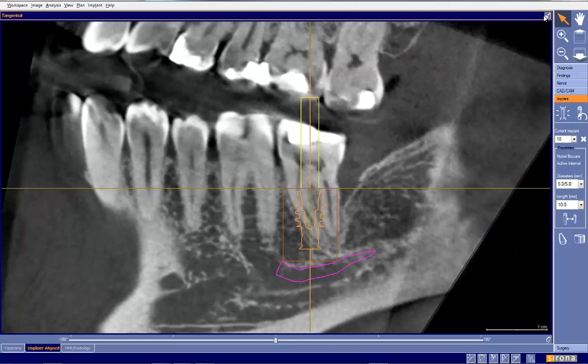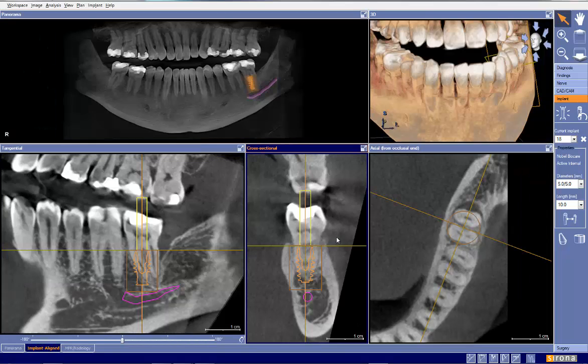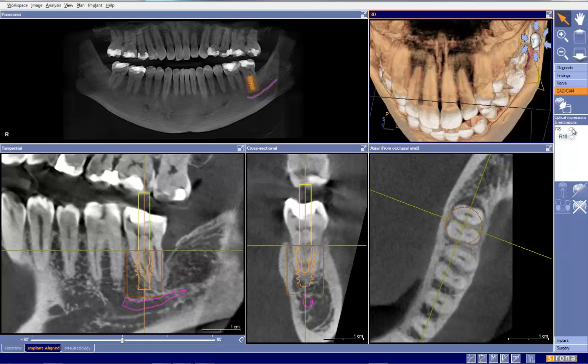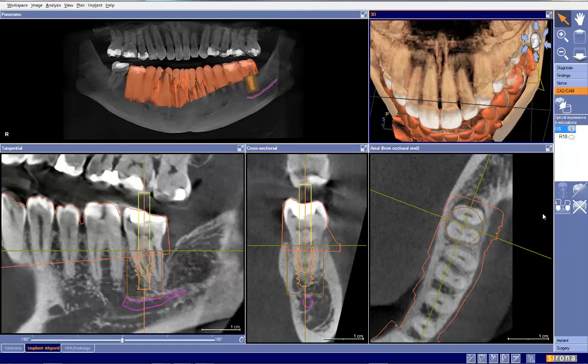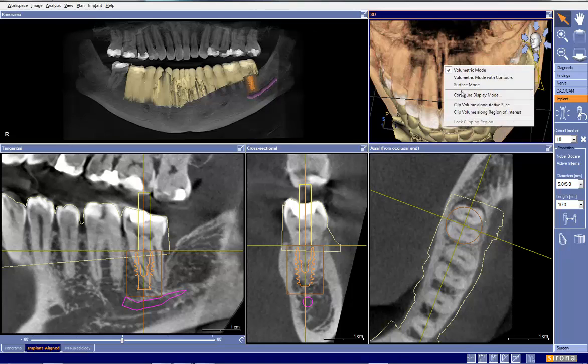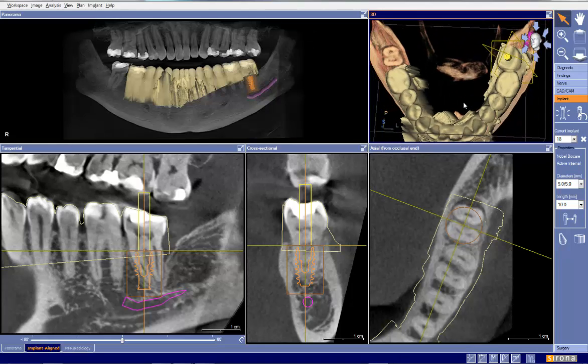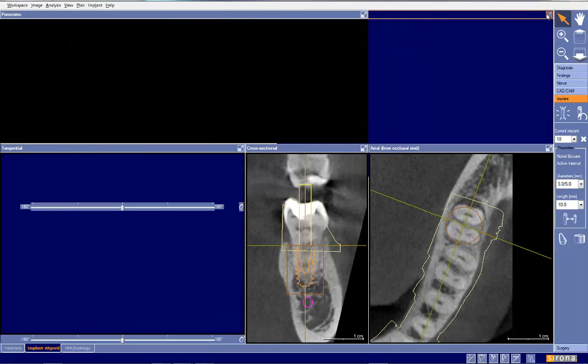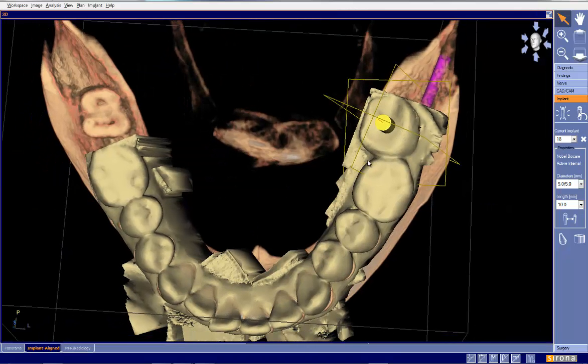Now, the next question I have is, this is planned very nicely in the center of the tooth, but in noticing on your CEREC data here, one thing that I did notice here, we'll go to clip, is that this particular tooth is lingually rotated. So is our final restoration going to be at this particular position, or is it more ideal to be a little bit more buccal? I don't know. Only you can tell us that.